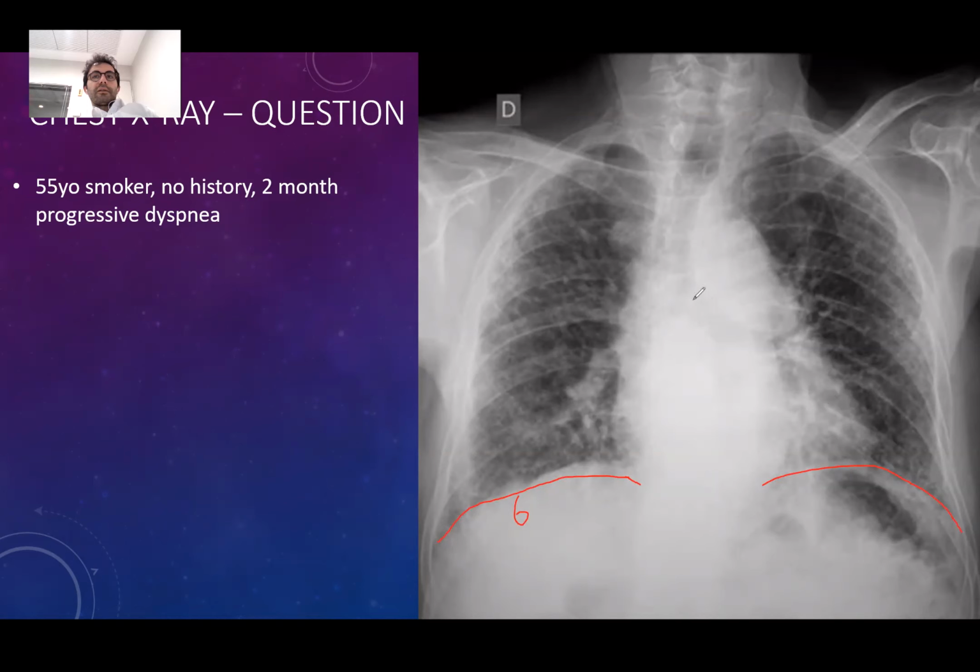The heart is not like a drop sign, right? There is cardiomegaly actually. You didn't mention that one, for example. So are there any reticular opacities? There are a lot of reticular opacities, plus nodular opacities as well. So, Abdulmelik, I want you guys to start systematically and say, for example, I'm seeing the scapula and it is fine.